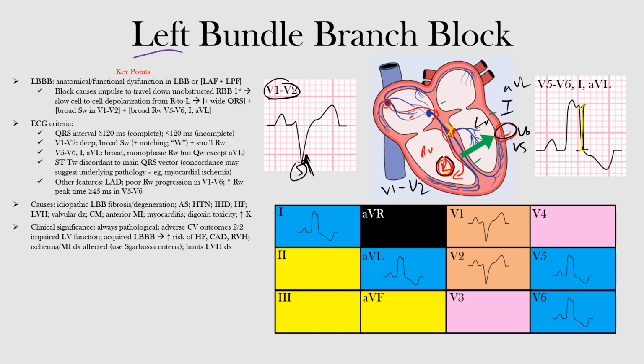And again, remember that we have wide complexes here. Okay, from the beginning to the end, our QRS complexes are wide because of that slow cell-to-cell depolarization that's moving from right to left.